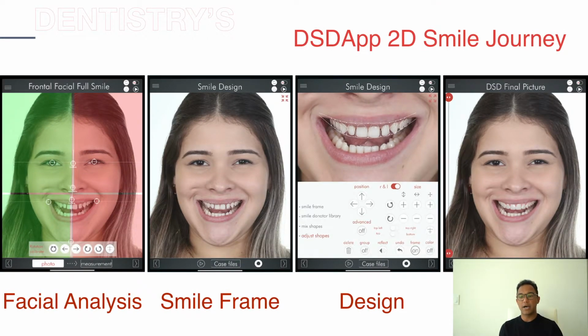So here's how the 2D smile design journey starts. You start with a facial analysis. As we said before, we believe that the smile must be matching with the face. Everything starts with the face. Then you start with the smile design. Then you set your smile frame, you design your smiles, and you can have the patient be the co-designer. You can have them help you select the right teeth and teeth forms for the aesthetic treatment. And then we have the before and after slides where you can give that wow factor to your patient.